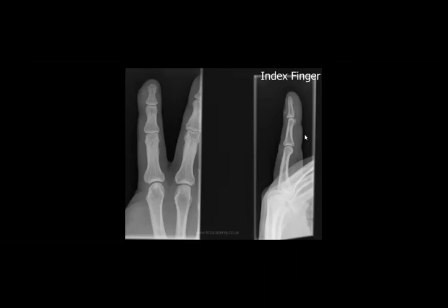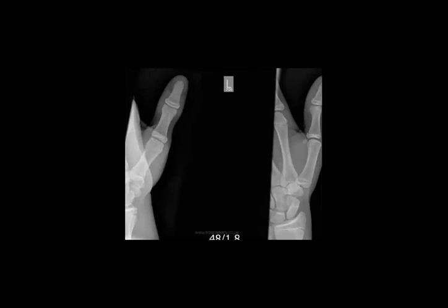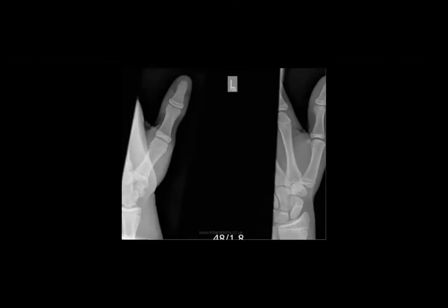Okay. Foreign body, perfect. So it can be this foreign body. It's a very easy one.